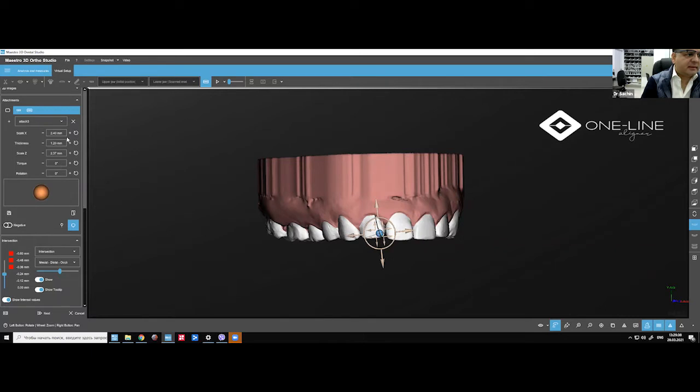So the third is the oval attachment. Okay, fourth one, I don't really use this one. Not this one as well. The most common, which will be for the rotation, will be the first one, or you can use optimized root control or ellipsoid. Okay, any questions, please just write down.